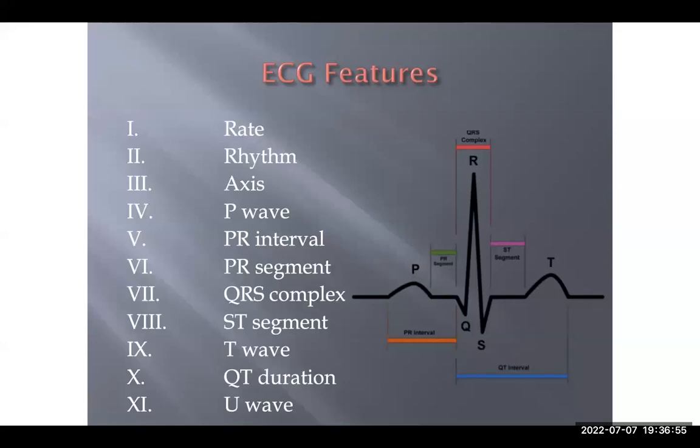The third way, if you're in a hurry, for example in an exam setting, and you have a rhythm strip below, in a 12-lead ECG printed on A4 paper, just count the number of QRS complexes falling in that strip from one corner to another and multiply that by 6. The same method is what you use to calculate the rate if a patient has an irregular heart rhythm. So if the rhythm is irregular, you use the same method. You just count the number of QRS complexes falling in the strip, as we'll see in the subsequent ECGs, then multiply that by 6.